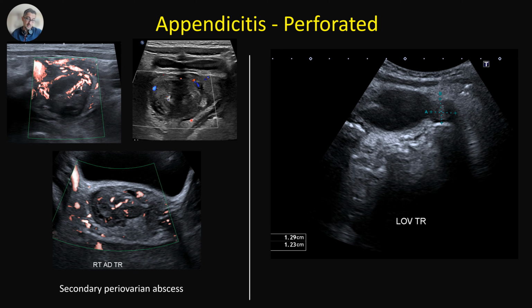So this patient comes during my call, and the resident sees the patient, and the resident thinks that this could be ovarian torsion because the ovary is large, there is still some flow, and there is increased flow. The resident thinks that this could be torsion, and during the torsion phase there is reactional compensatory flow in the ovary.